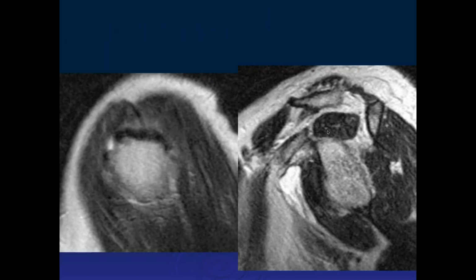Okay. Let's see, Pablo, what do you think of this case? Let's see, I have sagittal views, two sagittal views. So I'm looking at the greater tuberosity there, and I see the deltoid. There's a fluid signal intensity right there in the anterior aspect, that pocket there. So what is that? I wonder if that's a full thickness tear of the anterior fibers of the supraspinatus. So why do you wonder? Why don't you just say it's a full thickness tear?